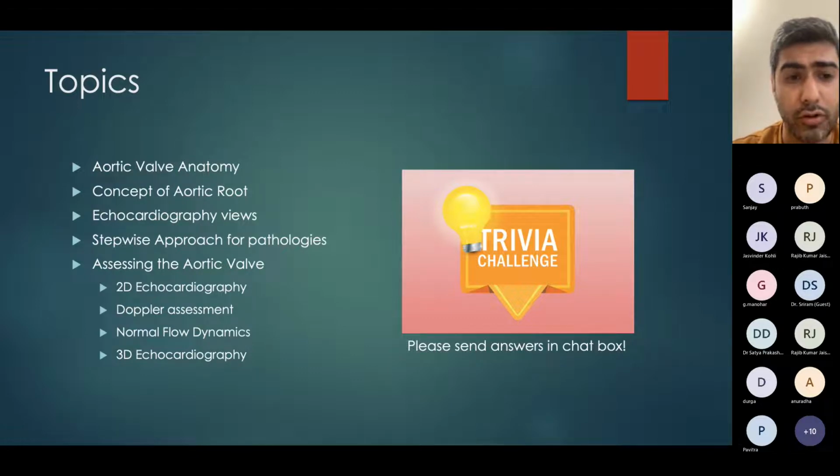I would like to highlight a stepwise approach to identify various pathologies, and then coming to assessing the aortic valve using various echocardiography modes like the 2D echo, the Doppler assessment, then understanding the normal flow dynamics and some basics of 3D echocardiography.